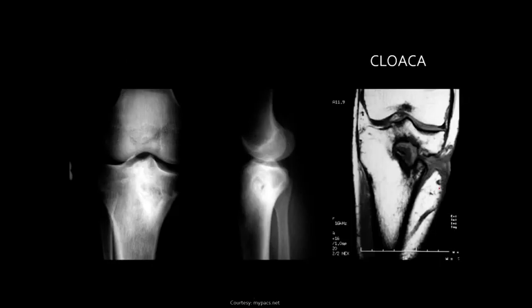All right. Another example of a cloaca. So we have this sclerotic change where we can kind of see a hole coming towards us now in this lateral view. So this hole here is likely this kind of change right in here. So we're getting this kind of area going out to the surface of the bone, and that's that cloaca. So here we see it on the MRI. There it is. There's the cloaca. In fact, it looks like it's going out to the skin tissues or to the surface tissues. So this would be a sinus tract. Oop, running off the image there. Sinus tract in that cloaca or extending from that cloaca.